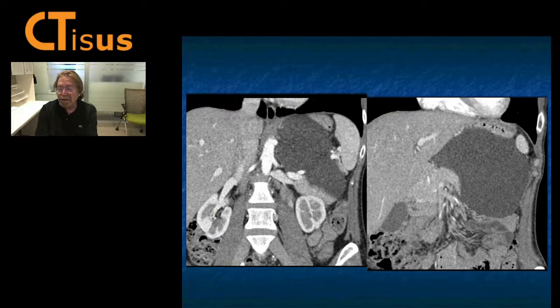This is not going to be a malignancy. This is not a solid mass. This is a soft mass that's pushing on stuff. Could it be a cyst like a pseudocyst? I guess it can, but it would be kind of funny looking. What else could it be? What gives you soft tissue masses? Hemangiomas? Okay, not that. That's vascular. Lymphoma? But again, that's solid. What things can do it? Well, one of them is lymphoceles, right?